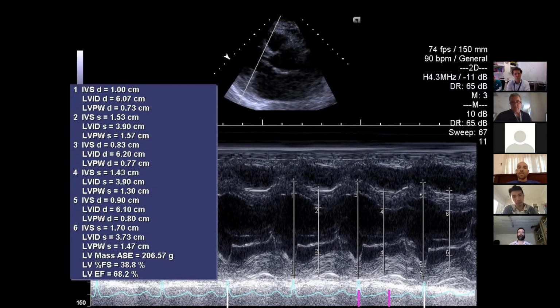What else are you seeing on this that you haven't mentioned? So you went for the ejection fraction. That actually wasn't the reason I showed this to you. What else is there? Well, there's the ventricular septum, which doesn't seem particularly thickened. The leaflets and mobility, and the coaptation, I guess.